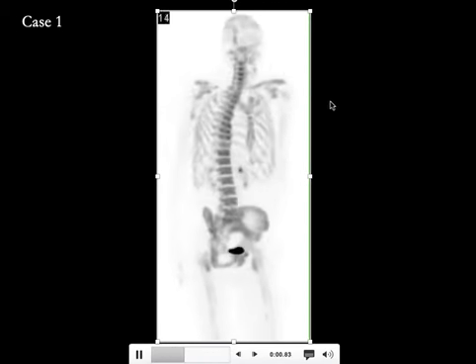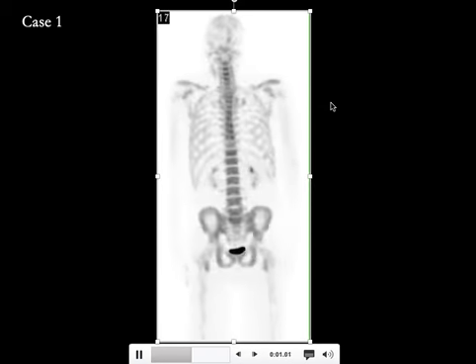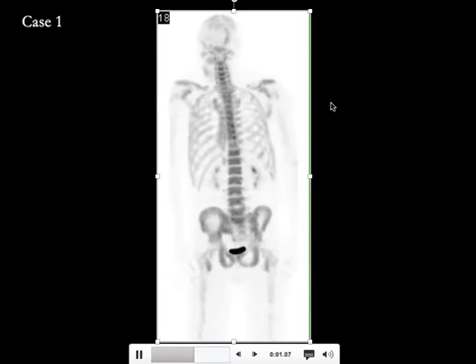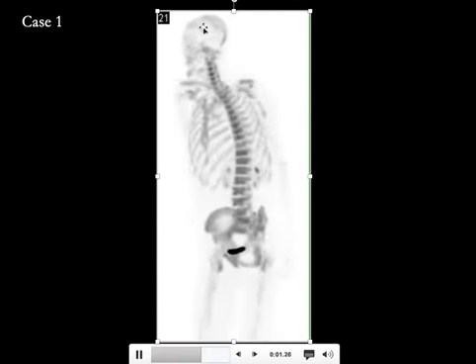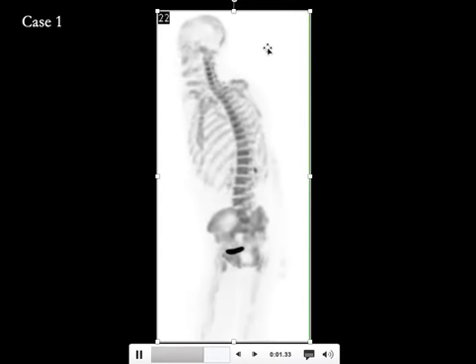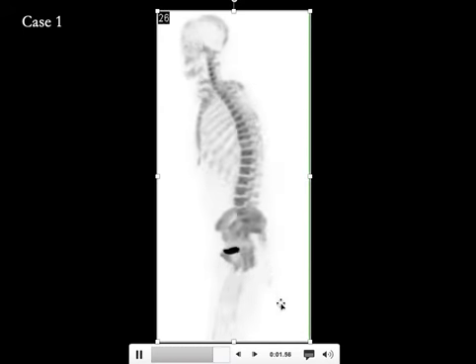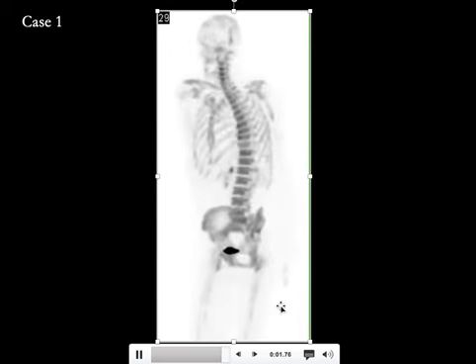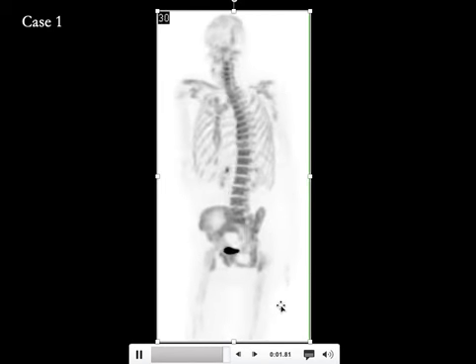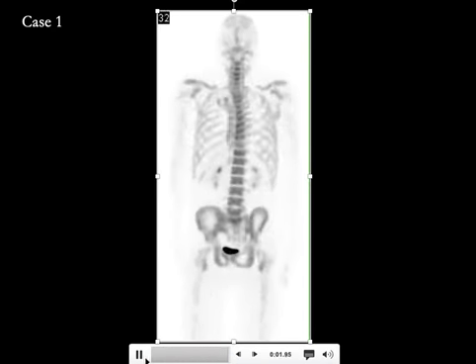The way to differentiate it, if you're finding it hard to differentiate this from an FDG PET-CT scan whole body MIP image, is to look at the brain. FDG is taken up intensely in the brain, but sodium fluoride is not. Sodium fluoride is a bone tracer, and this almost looks like you can call it a 3D bone scan. This comes with a low-dose CT, which is used for anatomical localization. We'll take a look at some images later.